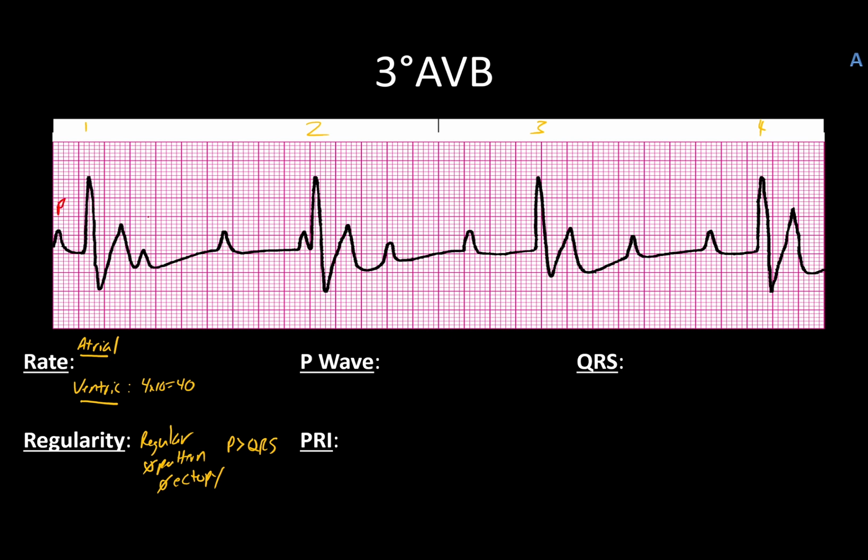There's 1, 2, 3, 4, 5, 6, 7, 8 P waves that I see. We'll go ahead and measure these out. Let's do between these two.